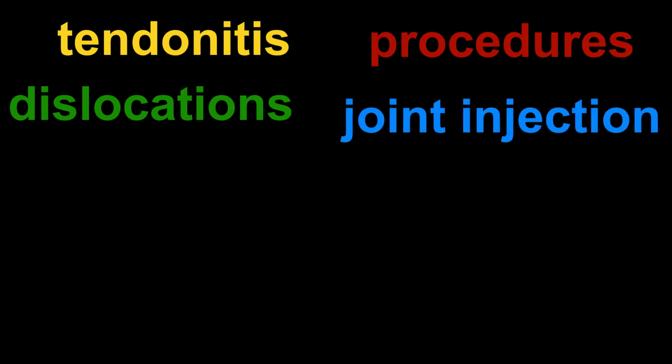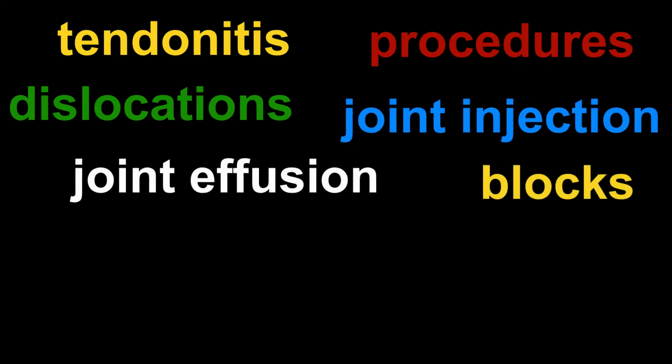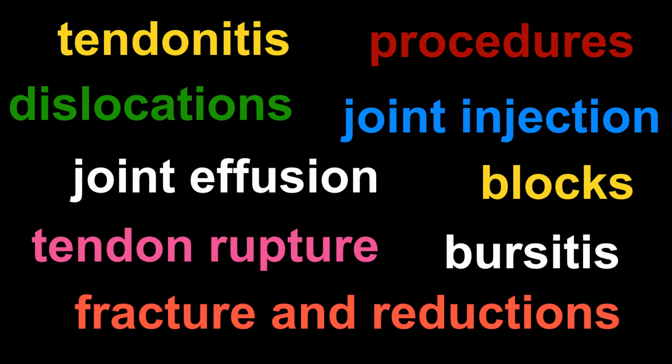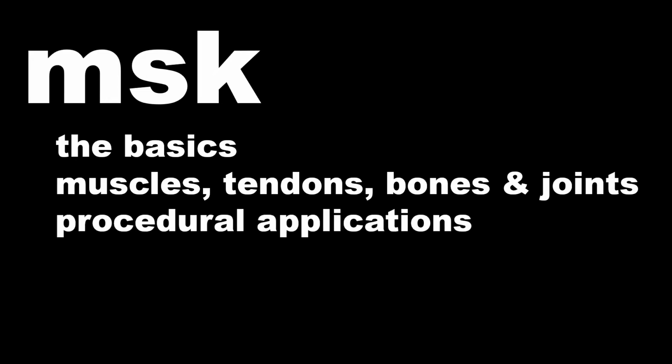I'll also start off by saying that there are many different applications for MSK ultrasound, and ultimately each of these can be its own lecture series in itself. So I'm going to briefly touch on some of this today, and I hope that I can leave you feeling inspired. To start, we'll look at just the basics of musculoskeletal ultrasound, how to perform the exam, and some tips that I've learned along the way. Then we'll look specifically at muscles, tendons, bones, and joints. And then last, we'll delve into some of the procedural applications and where I think that this could be the most useful for you.